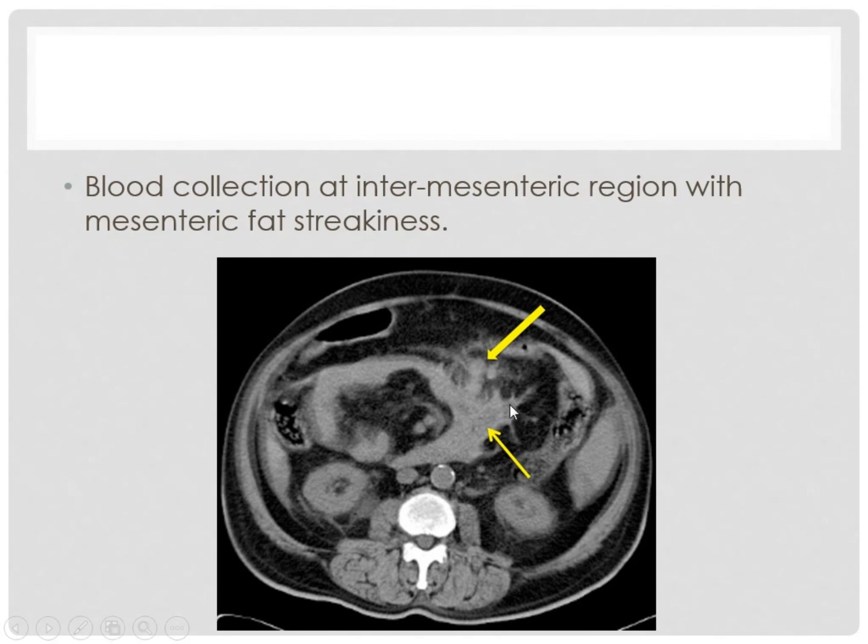You can see this is all contusion. It should be fat, should be just like that. But you can see here multifocal areas of fat stranding, with history of trauma, of course. And I think there's some gas containing something here, maybe not only on this image, we need more images, but mesenteric injury or omental injury is very likely here.